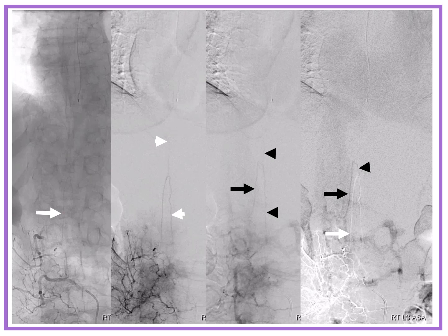Now, in the image that's most to the right, you can get this Kool-Aid thing that we like to do, which is to make the mask out of the arterial phase. So the arterial phase is the mask, and then the venous phase is the digitally subtracted image from the arterial phase. And so you see the arteries and veins at the same time.